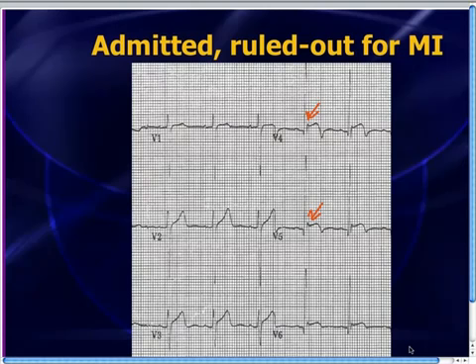Okay, so this is a common mimic that you're going to see if you get EKGs on young men. Young can be up to 40, 45 years old. You can see this pattern. It tends to be most common in African American men. One of the articles I saw actually reported that it tends to be most common in African Americans of Caribbean descent. I don't know whether it's limited to that particular ethnic group. I've seen it in a lot of other men as well.